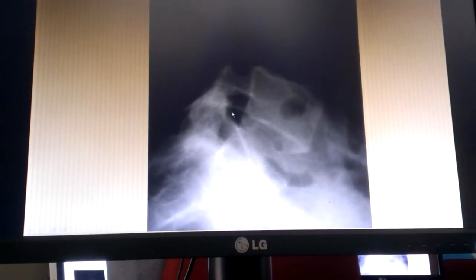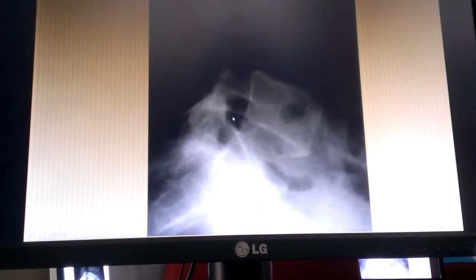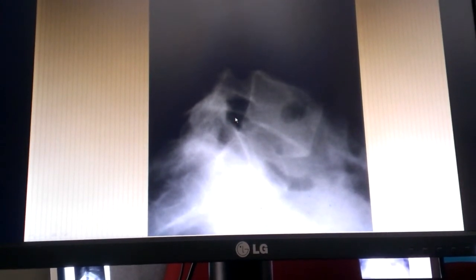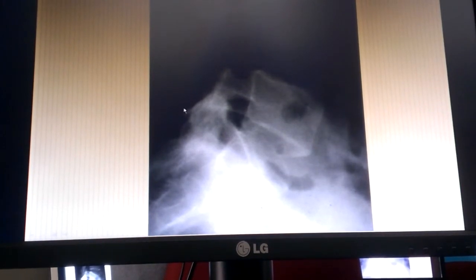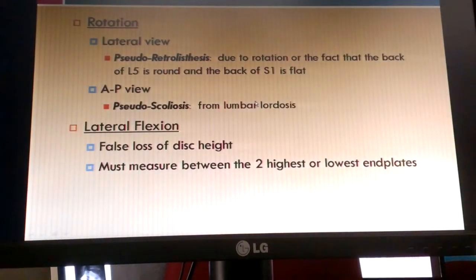The IVFs, remember, this IVF here at L5-S1 may not look as big as the other IVFs, and why is that? I think that was on the test? I think you had that as a first question, I'm not sure. I'll have to go back and check. But it's because they're angled, because we know that the anterior sacral foramen are on an angle, so you're in an area of transition. So the central ray is not as aligned with these IVFs as it is with the others.